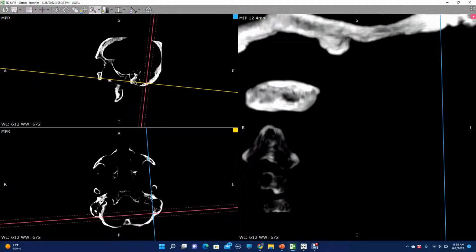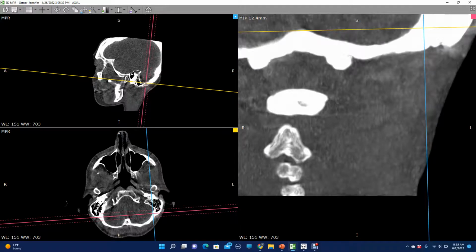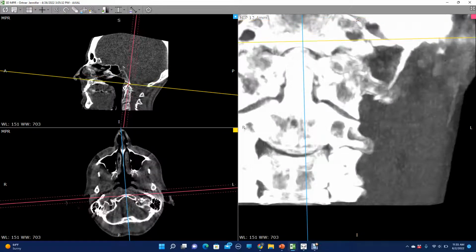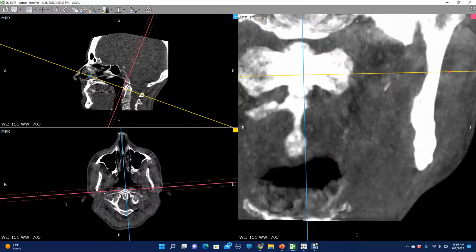Okay, so let's go ahead and try to see things again. And we are ready for our horizontal film. And what's good is this line we haven't touched is still right through the middle of the skull. I like to view my atlas on this along the atlas sagittal plane.